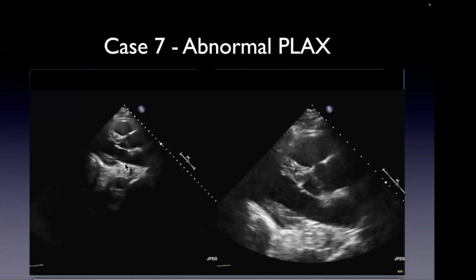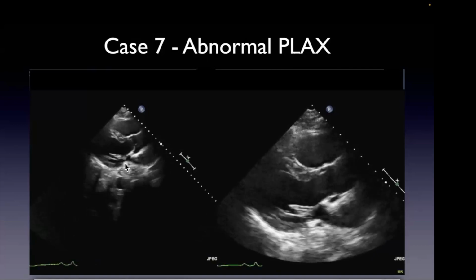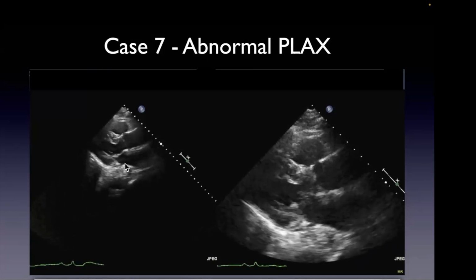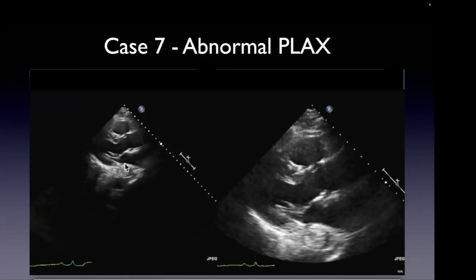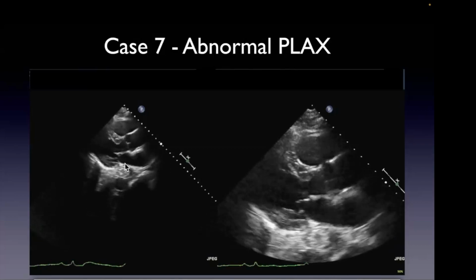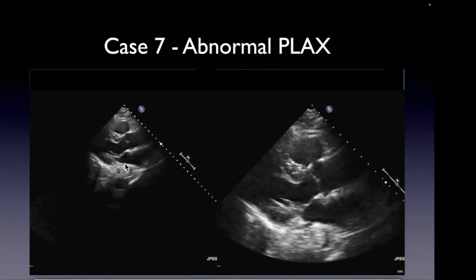This is a patient with metastatic gastric cancer who had a stent put in for obstruction. It's in the differential when you see an echo-free space, because a hiatus hernia is essentially an extension of the stomach up into where the esophagus should be. Sometimes we'll see echo-free spaces here where it's possible that it's a hiatus hernia. This is kind of a variant of that. This is an esophageal stent. Only one I have in my collection.